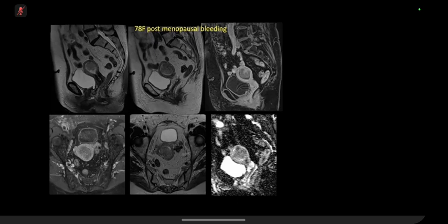Based on these images alone, I think the myometrium is of normal thickness, but possibly on that second image, I think that there is some invasion into the myometrium. I think my differentials for this would include, and I think they're suspicious for an endometrial cancer, but I would also consider this likely an endometrial polyp. They'd probably need a hysteroscopy.